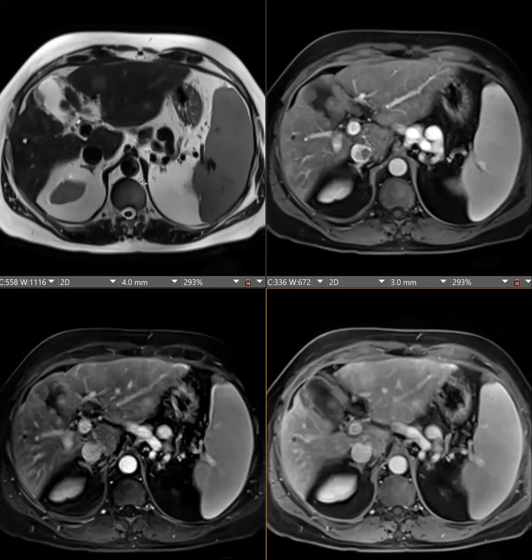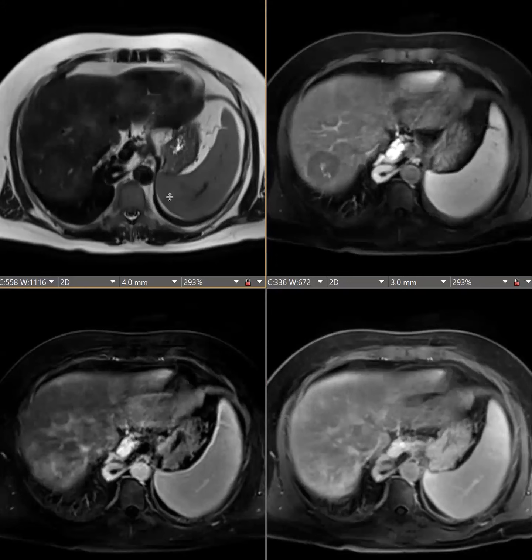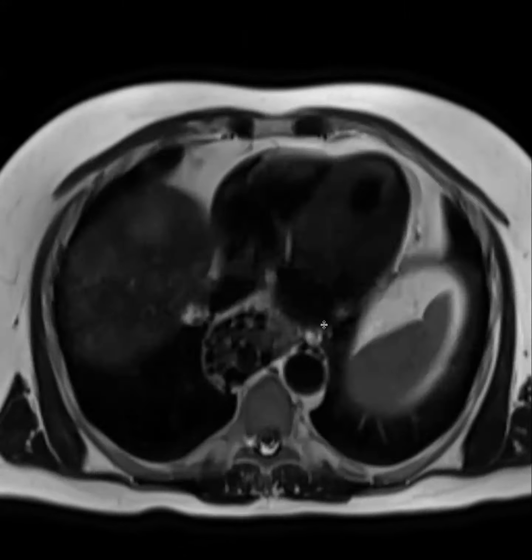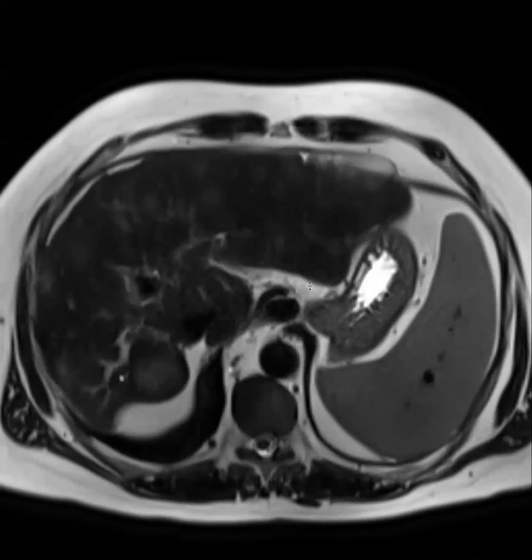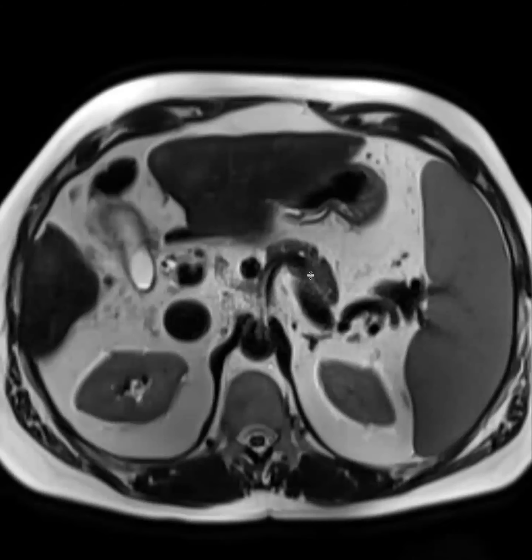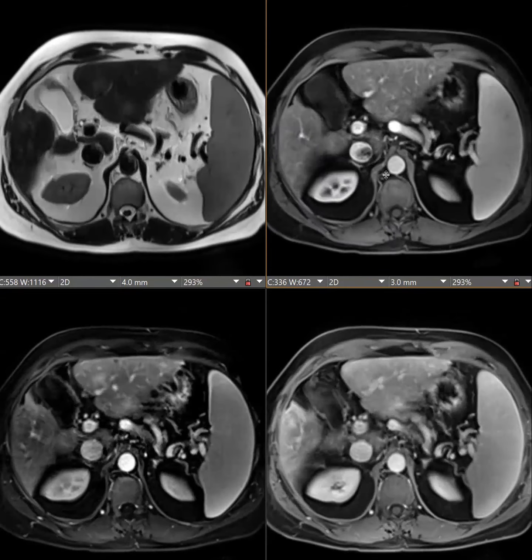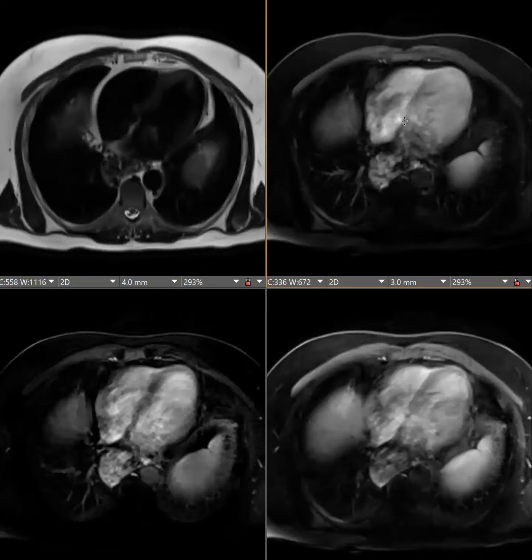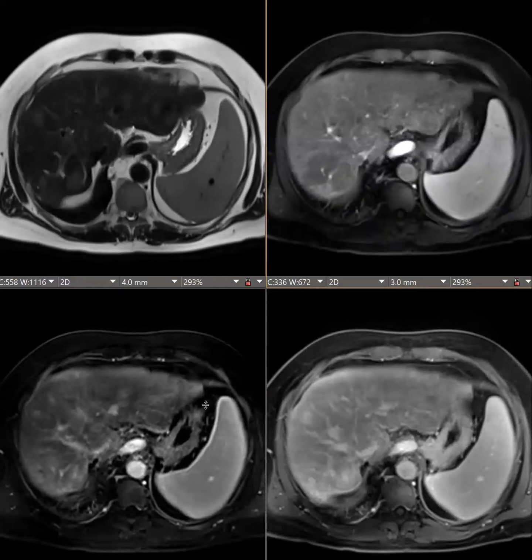This was the other companion case where we raised hepatic peliosis. No, we don't have path because it's just being surveyed. This is the T2. These lesions are multifocal. Prior biopsy was benign. Let me just double check that that was the case. Actually, I take that back. I'm not sure if we had a prior biopsy. I feel like we should have. And I vaguely remember we did.